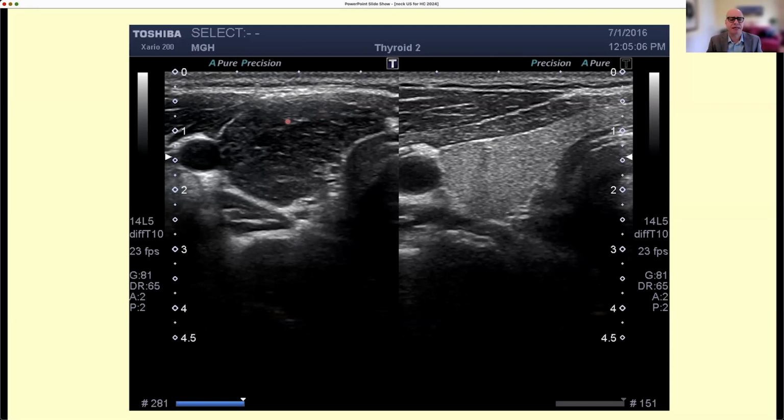Now, can we say whether this is Hashimoto's thyroiditis or Graves' disease? Who wants to answer? You can't tell. You can just tell that there's an autoimmune process, right? You cannot tell whether this is Graves' disease or Hashimoto's. They can look the same. So when the radiologists say there is a pattern consistent with thyroiditis, they can't say that. And we wrote a paper to explain that to them. They haven't read it, because they continue to say it's consistent with thyroiditis. But the critical thing is having this hypoechoic pattern in any inflammatory condition that involves the thyroid gland.